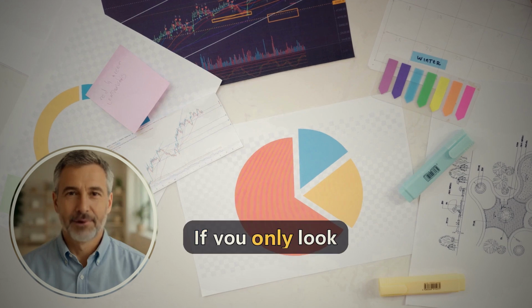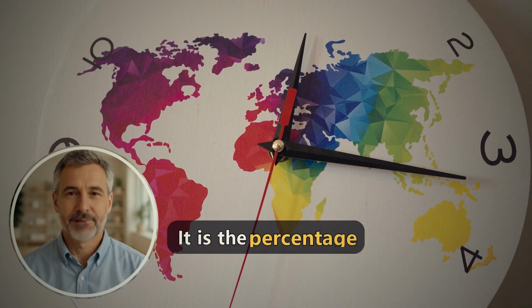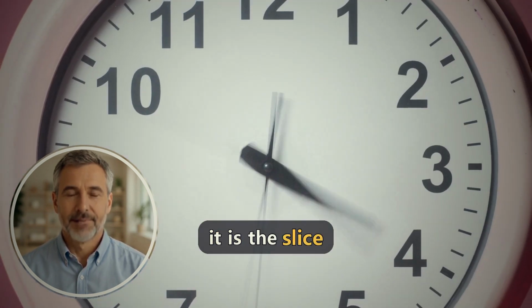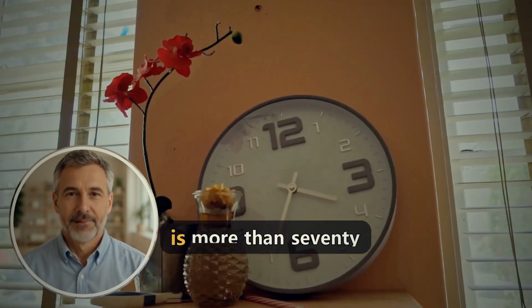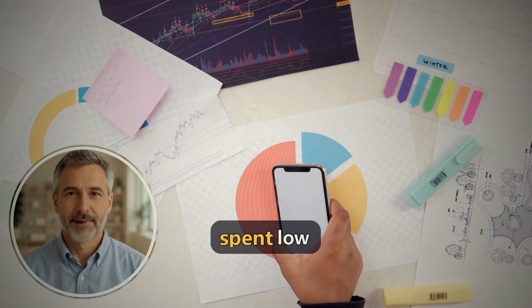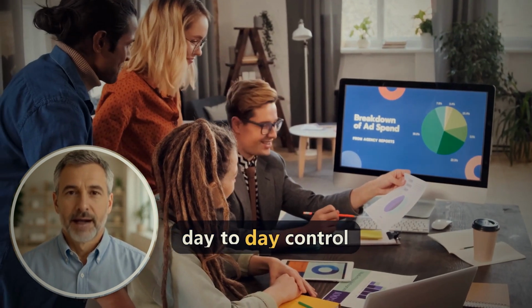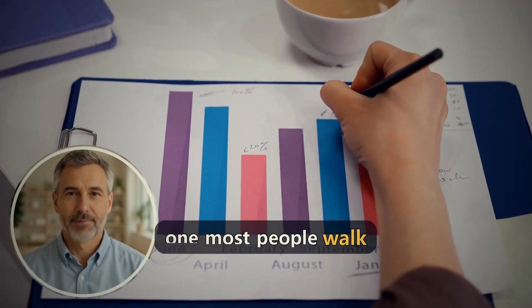Both matter. If you only look at one thing on the whole report, look at this: time in range. It is the percentage of your readings that landed inside your target band, which is commonly 70 to 180. In plain terms, it is the slice of your day your blood sugar spent where you want it. A widely cited goal is more than 70% of the day in range, with less than 4% of the day spent low. 70%, so about 17 hours out of every 24. This one number tells you more about your day-to-day control than almost anything else on the page, and it is the one most people walk right past.